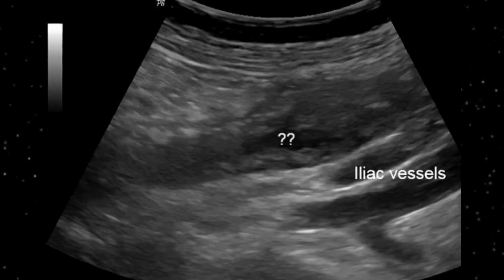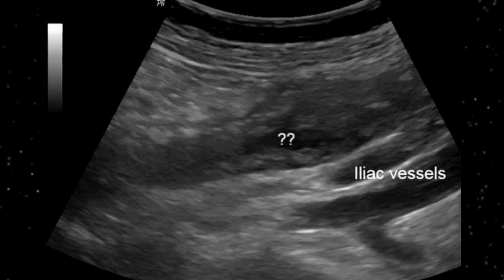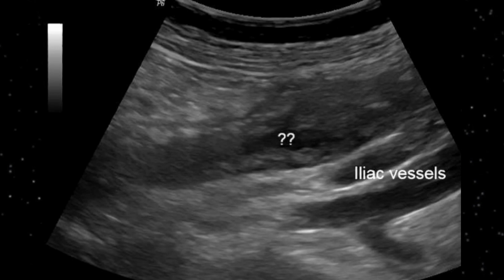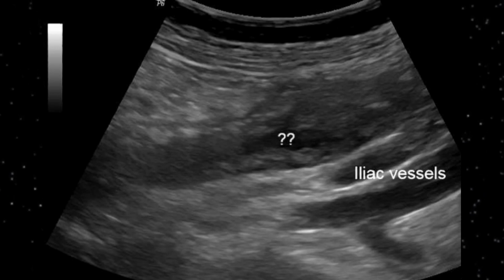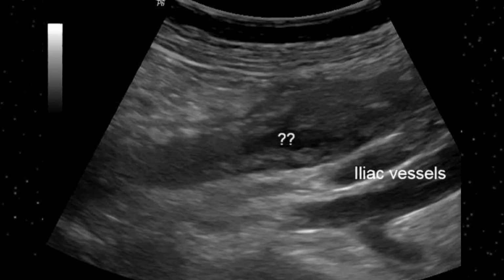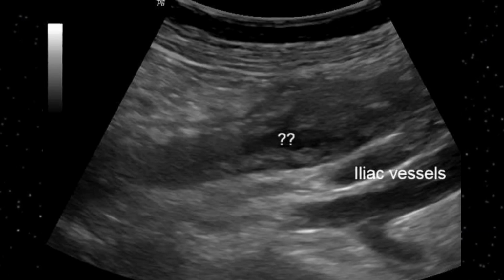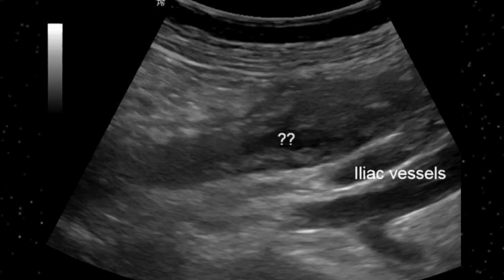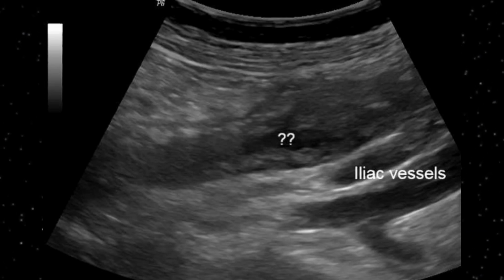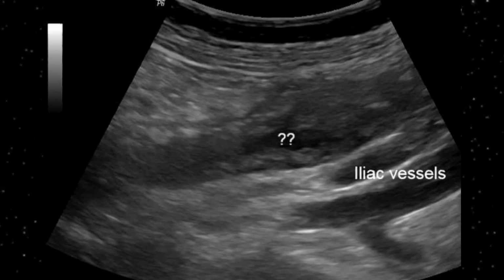Have a look and try to identify the intraluminal narrowing, intraluminal thrombosis, and intimal thickening. All these features can be seen on this particular image. The sign of interrogation is showing what it is. Actually, it is luminal narrowing, surrounding intimal thickening, and also thrombus formation. So this is exactly what the thrombus is.